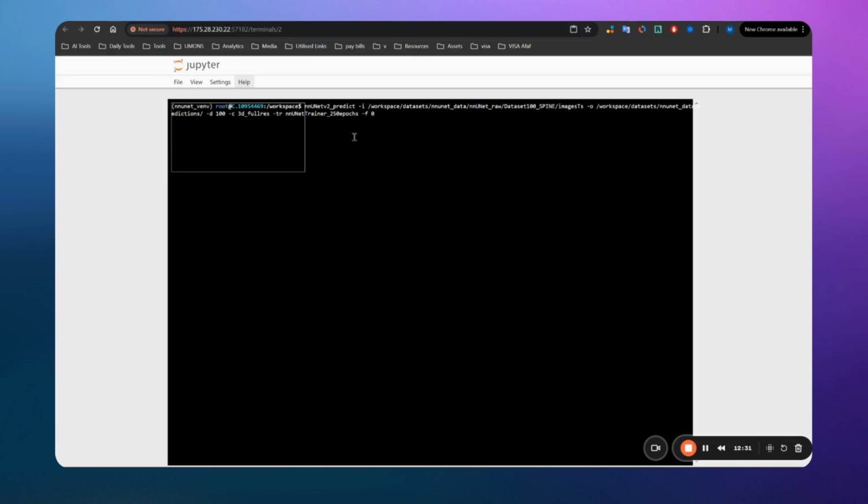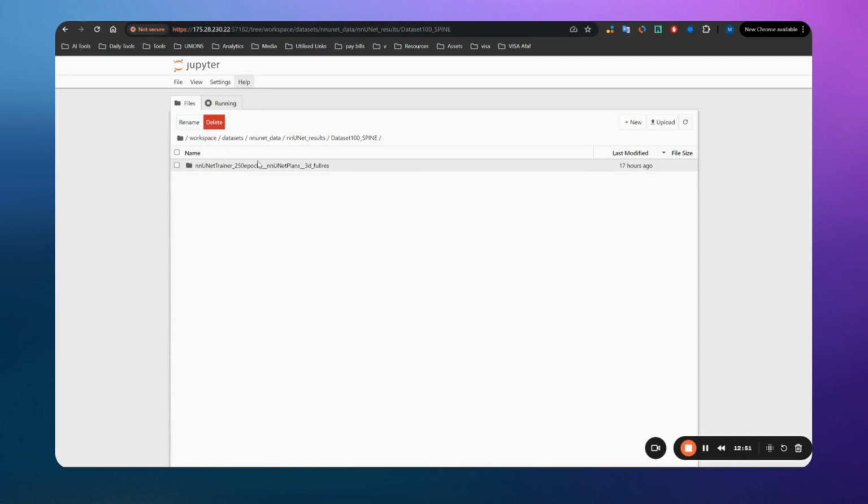And then the other thing, which is the fold, either 0, 1, 2, 3, 4, or all, which we discussed before. It is the validation set that we wanted to use, either the first portion, second portion, or all the portions. Since we used 0, I will put 0. Why do we need to specify that?